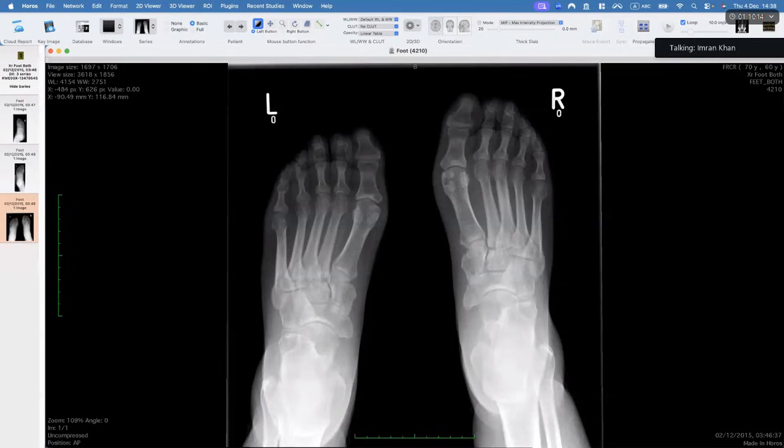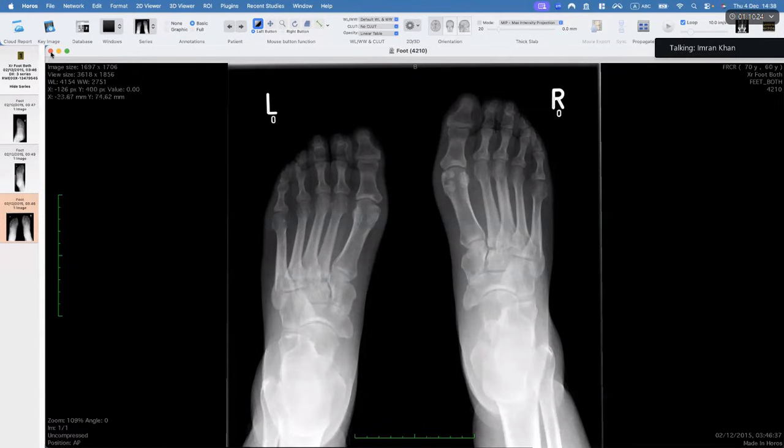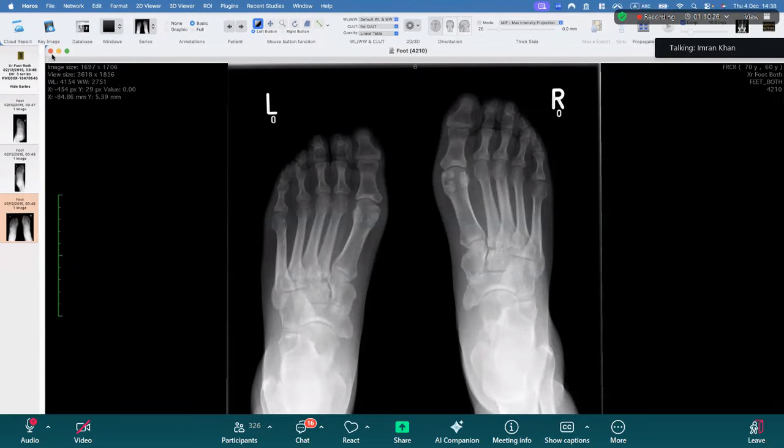The reason I actually showed you this was because on the first case you said, atypical appearances around a joint, possibly gout. So I'm like, okay, this person knows gout. I'm going to bring gout into the picture and see what this person tells me. Okay, but this is not osteoarthritis. Osteoarthritis, you can put it as a differential, but it would not be my primary differential. Primary differential would be gout or some other erosive pathology. Okay.